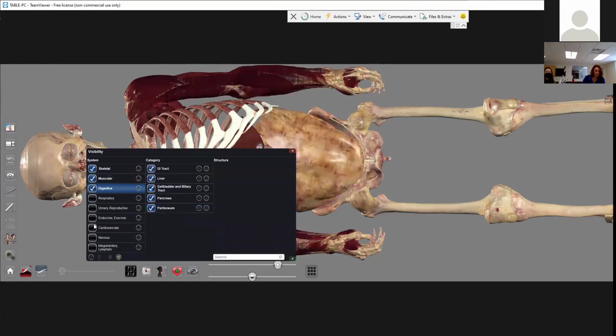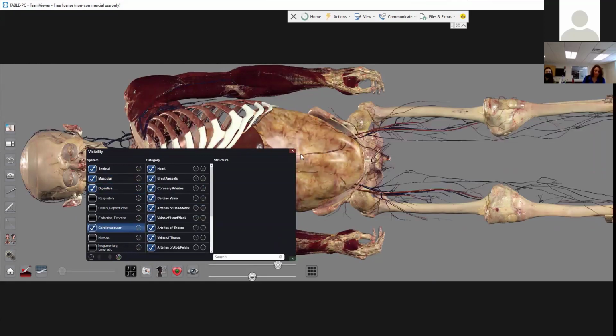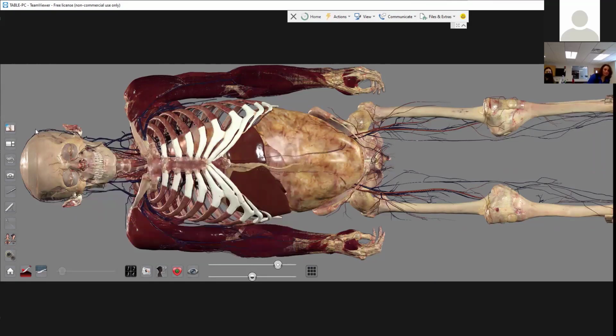Trying to get some stuff so I can show you all the different things that this tool can do. Okay, so Learning Assistant, this is such a weird view I made, but it's going to be helpful, I promise. Learning Assistant is this book with a magnifying glass on it, and this is just going to tell you relevant information about any structure you select.